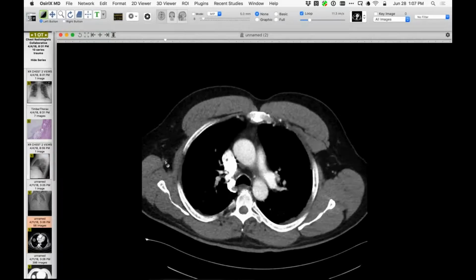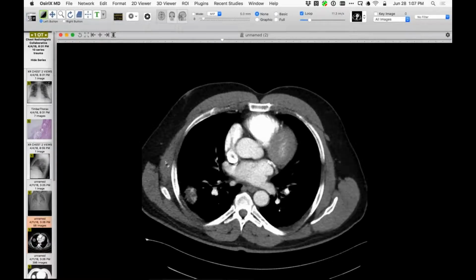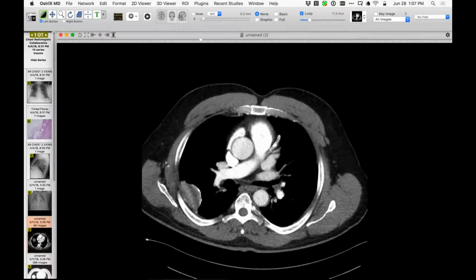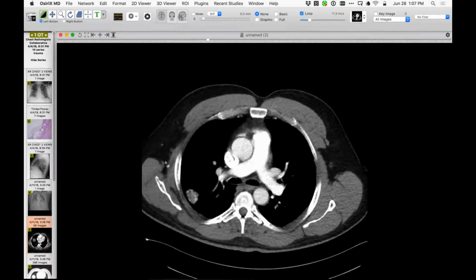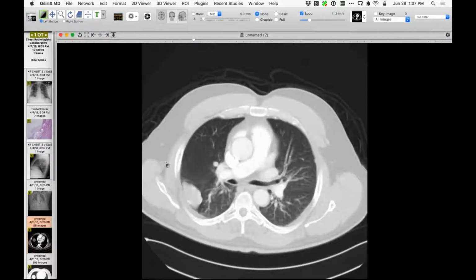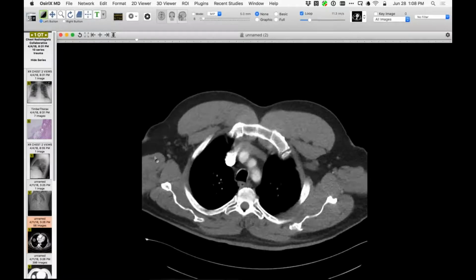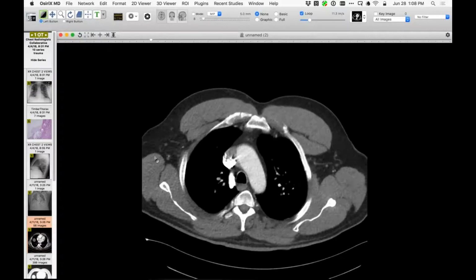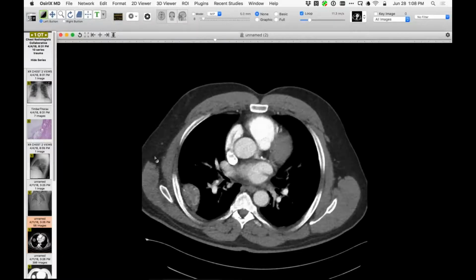So let me show you the CT, and you'll get an idea of its location and its attenuation characteristics. It clearly has some dystrophic calcium associated with it, mostly in the periphery, pleural-based, or at least close to a pleural surface. As you see there, I'm not revealing any history, which when I looked at the medical record, we didn't have, and I wonder if the history was secured after the lesion was removed.